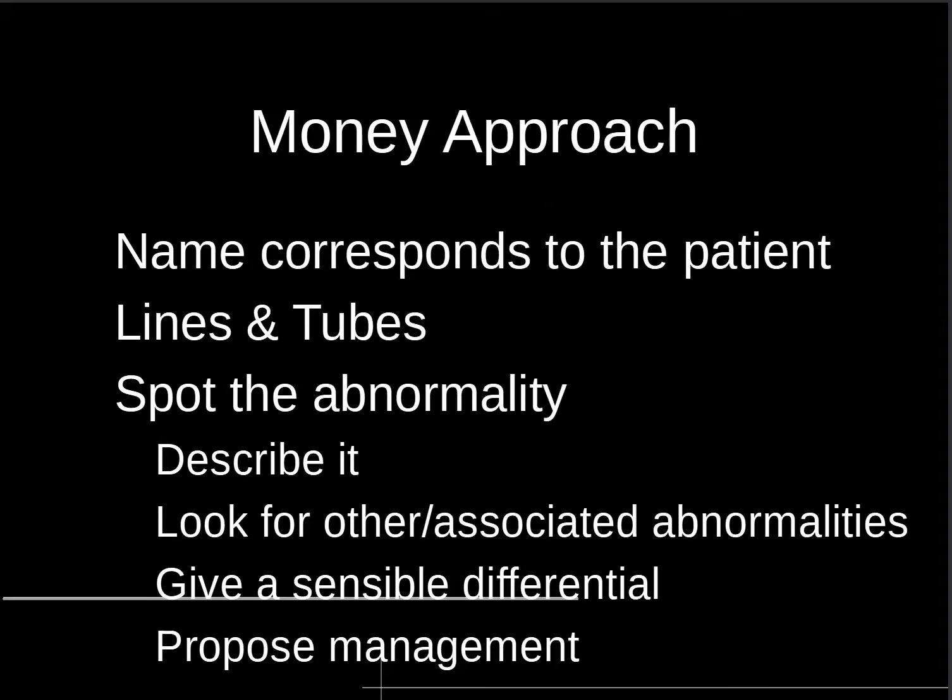Okay, so let's look at the money approach to a chest x-ray. First things first is that you make sure that the name corresponds to the patient. I know it seems a fairly simple thing, but believe me, there are many cases where doctors, healthcare professionals diagnose the wrong thing on the wrong patient because they haven't performed this basic check.